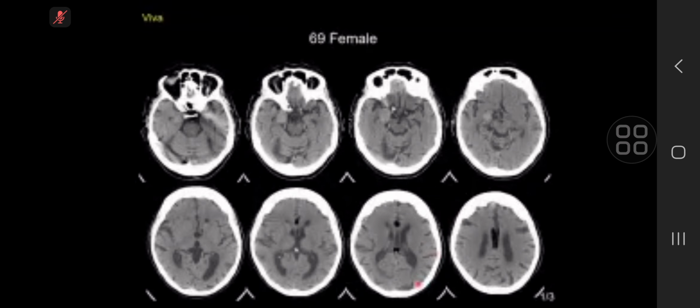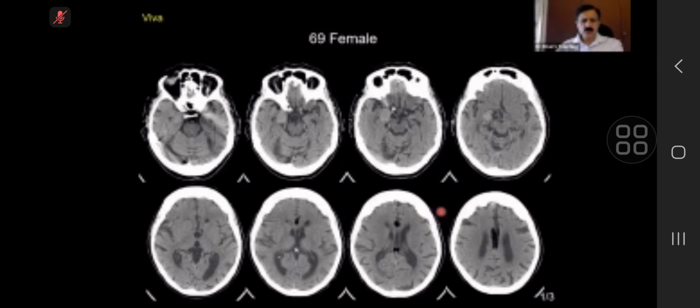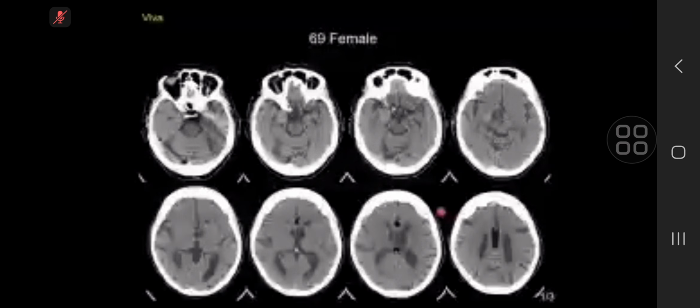It's a rounded, high-density lesion, which appears to have some possible peripheral calcification. I'm not sure if that's just projectional. That's most suspicious for being a large aneurysm, possibly an MCA. What will you like to do? I'd like to give contrast, a CTA.